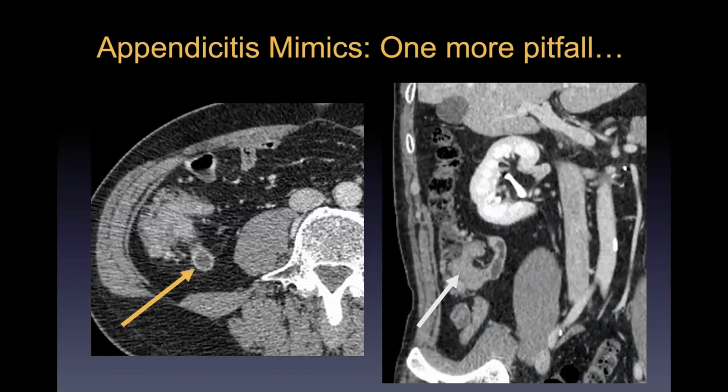So certainly when you see this look in the appendix and it doesn't seem to fit clinically, do scrutinize the cecum as well. We did not notice this on the initial read of the scan. Fortunately, the patient happened to have screening colonoscopy like 3 weeks later and it was caught.